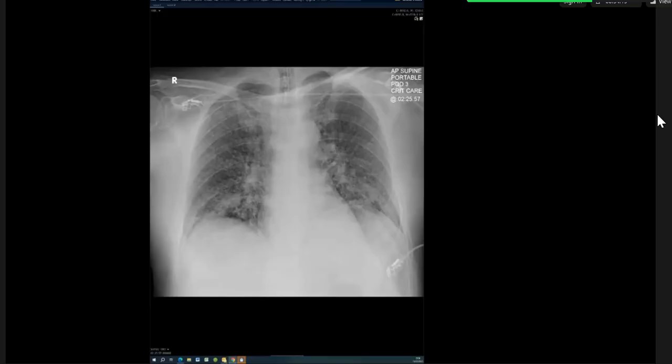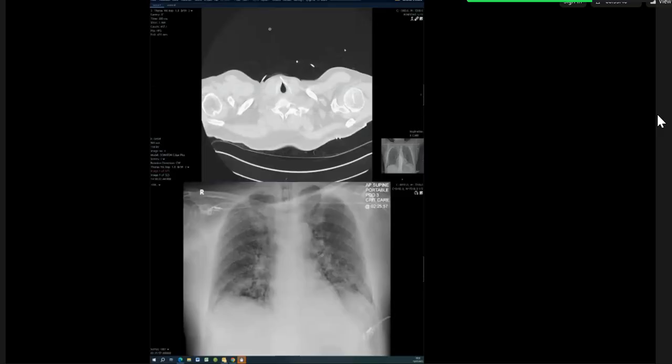And I would say immunocompromised. So this could represent a fungal infection, so Pneumocystis carinii pneumonia. Sorry, this could be miliary tuberculosis in an immunocompromised patient. What do you want to do next? I would like to do a sputum AFB culture to confirm my radiological findings. I don't have a sputum.